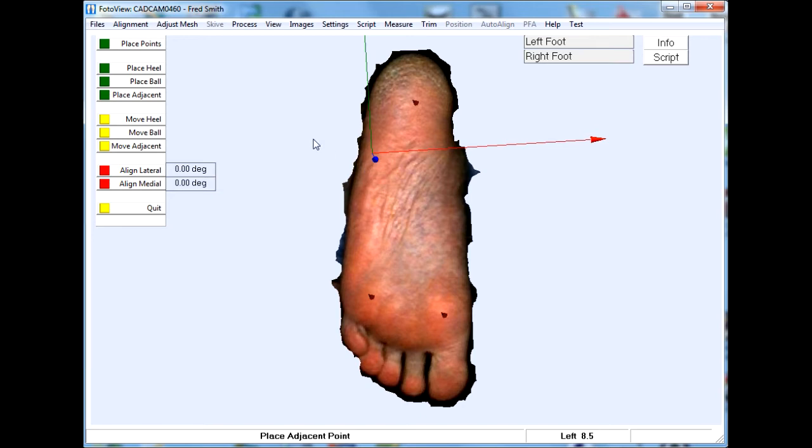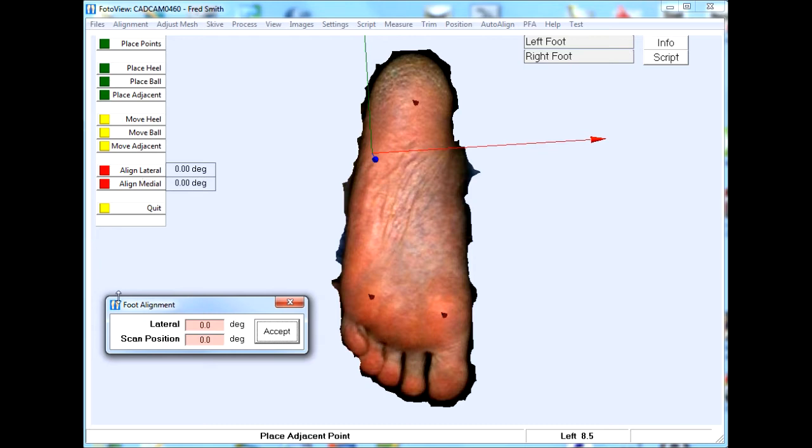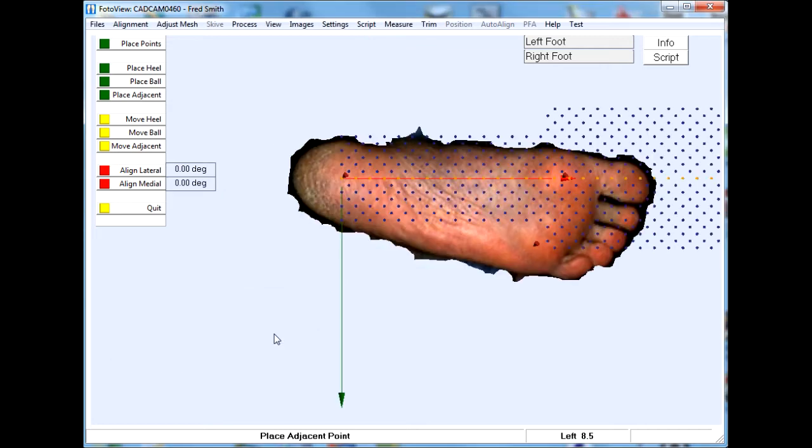This defines a plane. We can now align this according to whether we want a lateral or medial alignment. This relates to any varus or valgus angle. In this case there is no angle specified, so we can choose either. We then get a choice to overwrite some values. These would typically come in the configuration file. At this stage they're also 0, so we accept that.